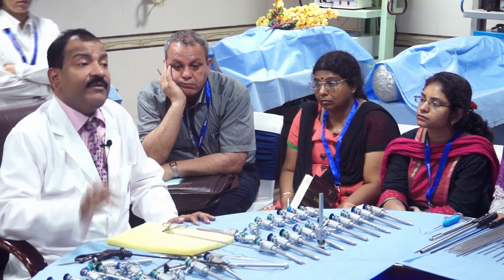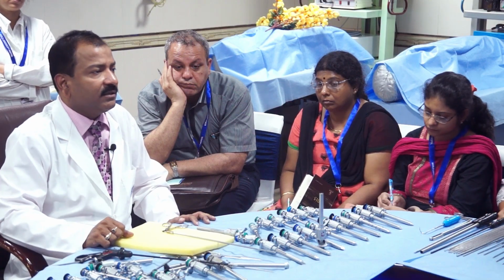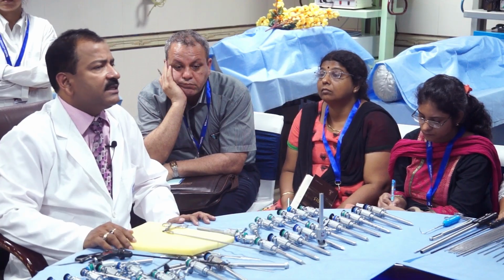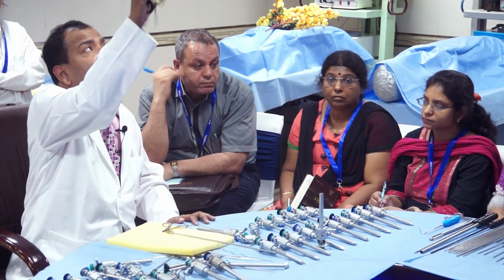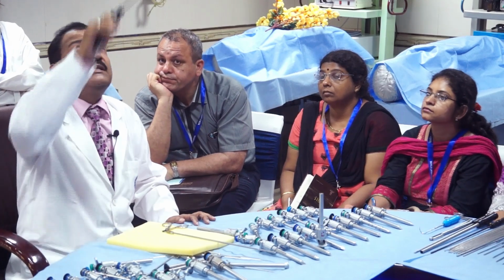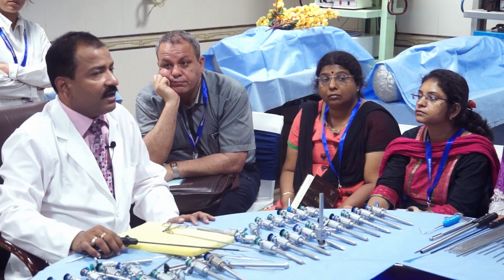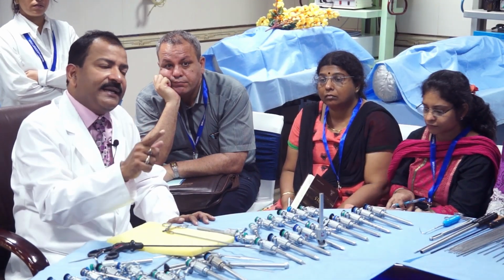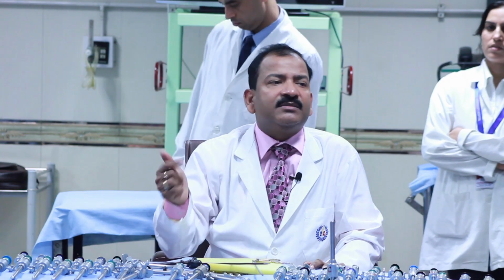Anyway, even the OT light should be 20 lux in laparoscopy. If it is a very bright operation theatre, you will see artifacts on the screen. Can you see those lights on the screen? Every screen has some light. The pictures of these lights are visible on the screen. Those are glares. Once the image comes, those glares fused with the real image will make an optical illusion. And that optical illusion will change the anatomy and we will make a mistake. So even the OT light should not be more than 20 lux.